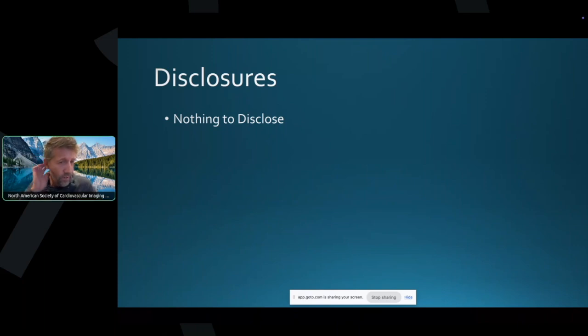I'm just going to show selected images for each case. I don't have any full volume diagrams here. Most of these cases are very straightforward, really.